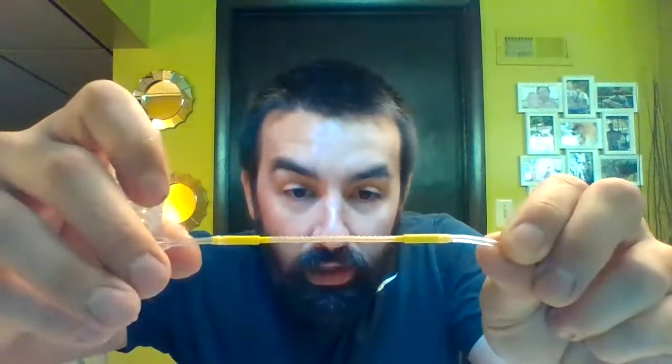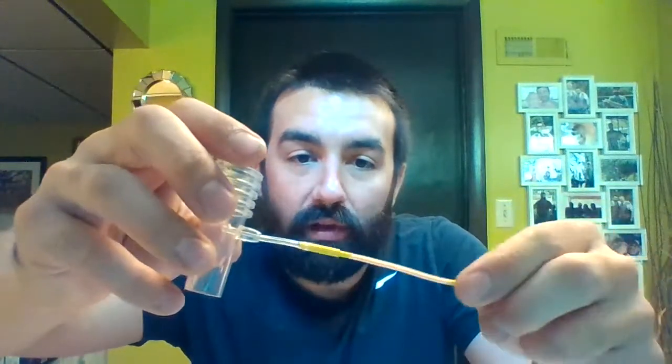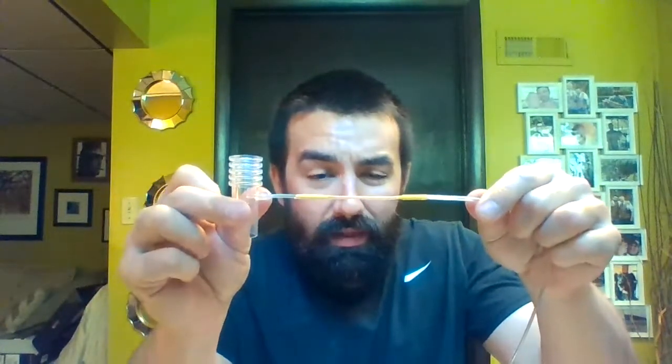If you look really close, there's a little bit of braiding right there. That's like a filter line, so it's supposed to be a little more impervious to moisture and stuff like that from our intubated patients. If you come across some at the hospital and you see some with this that are yellow, you'll also see some that are orange and don't have that. These are usually a lot better for our patients when we're worried about moisture.